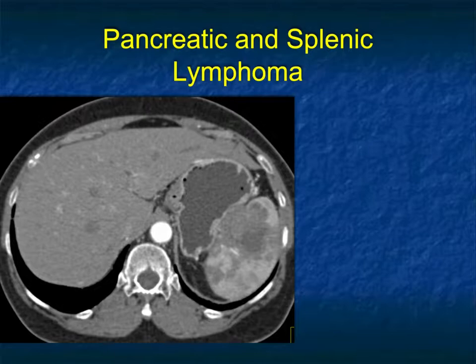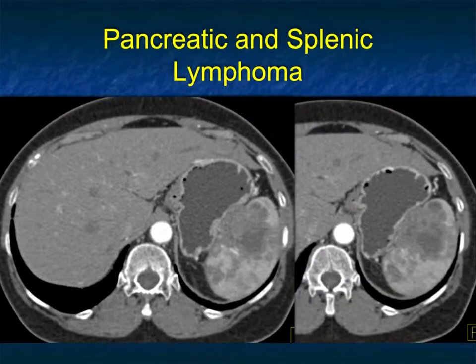Here's an infiltrating tumor in the spleen. I don't think you're thinking about benign or infection. This looks like tumor. Lymphoma is on the top of your list. Could it be metastasis? Whatever it is sure looks like it's malignant.